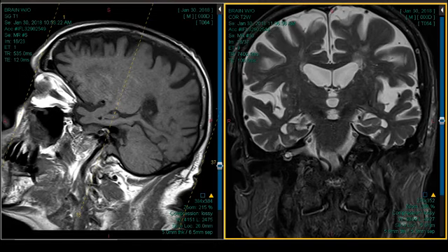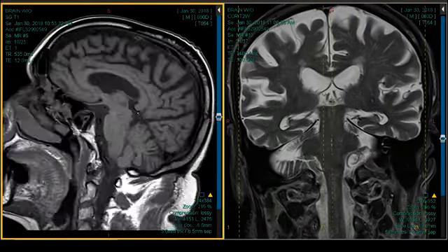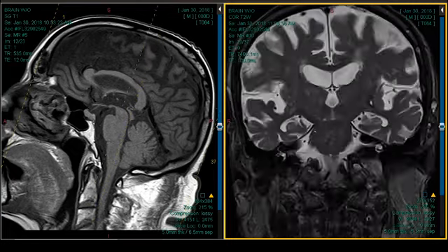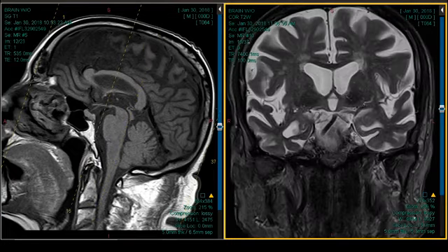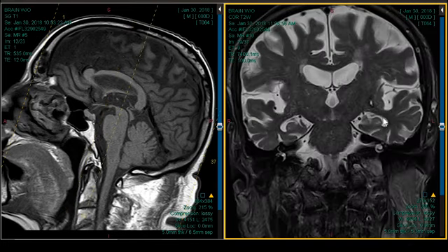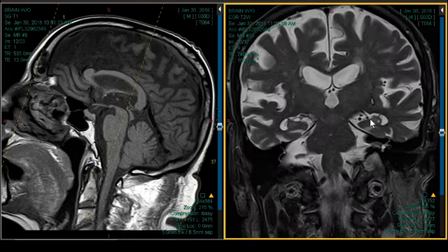So here's your collateral sulcus, right? So everything medial to this. Okay, so this is just to kind of pull it together because it's not a multi-system. Well, if you could point to the collateral sulcus one more time. Okay. So between the collateral sulcus and the choroidal fissure is where you want to look. Yeah, so it's wide and the white matter is thinned. So here's the collateral sulcus and here's the choroidal fissure. So this is the area that you want to focus on in ALZ, and especially the top part. You don't want it to be flat. You want it to be convex up. Right. And sometimes, if it's sunken down, this one is a little sunken down, that's really helpful.